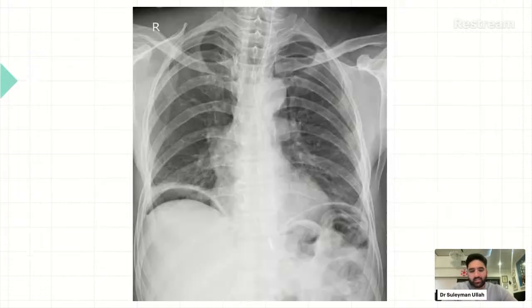Okay, next slide is, let's imagine it's the same patient. So it's this 22-year-old that we've diagnosed. We've got the CT, that we've diagnosed them with appendicitis. Initially, the patient just had uncomplicated appendicitis on their scan. Now, what worries you about this X-ray?